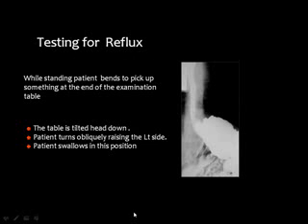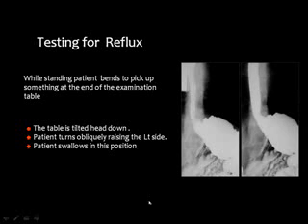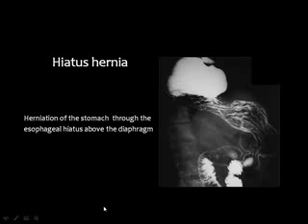There are many ways to test for gastroesophageal reflux, but the simplest one is to put the patient on his right side and ask him to swallow anything: his saliva, a little amount of water, some amount of barium. Then during this act, you will see barium coming from the fundus of the stomach into the distal part of the esophagus, and you confirm the gastroesophageal reflux.